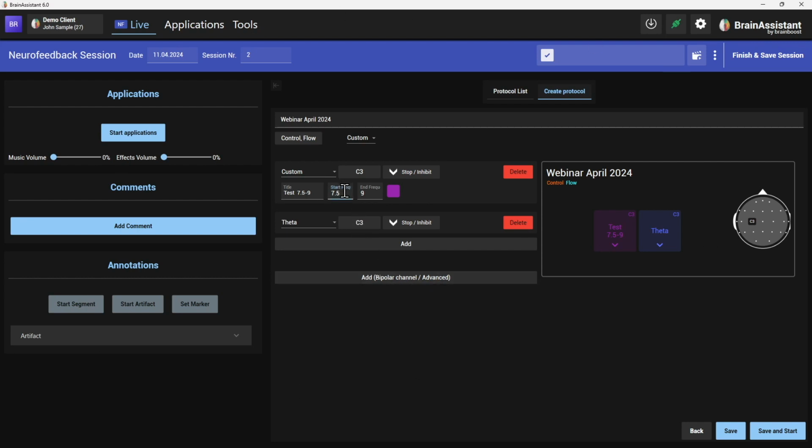If you use, for example, German or Spanish, it will be a comma. I know it's a little confusing. It's turned around. We are thinking about implementing a warning signal, because if I would write 7.5 with a period in German, it would actually be 75, which doesn't make sense. So English is a period. This is a custom frequency band.